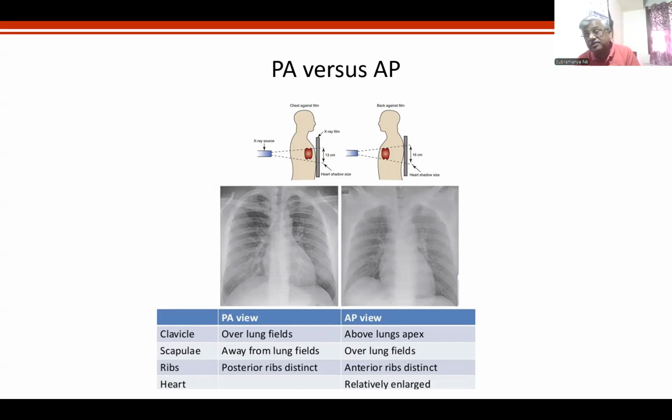By infancy, by default, there is a cardiomegaly in the sense that the chest is small, and AP makes it further cardiomegaly. Did you understand the point? It's not only about cardiomegaly. It also means that a part of the chest is swallowed by the heart, so I can see less lung. A radiologist in the Felson book, if you ask me, it is written that only 2/3 of the real lung you can see on an X-ray.